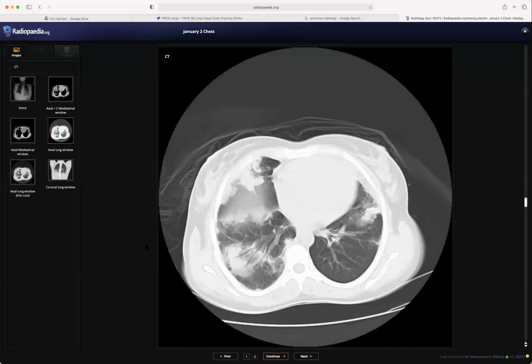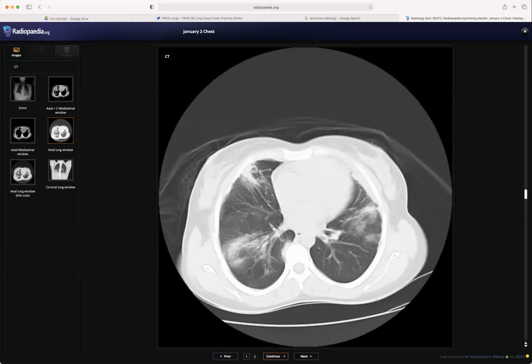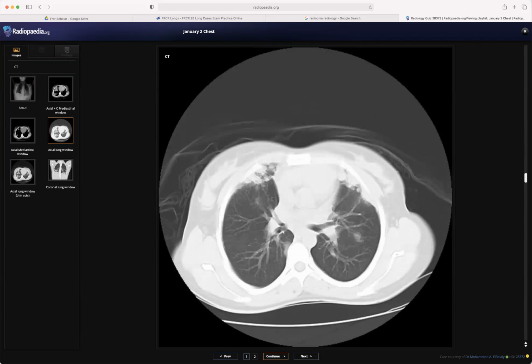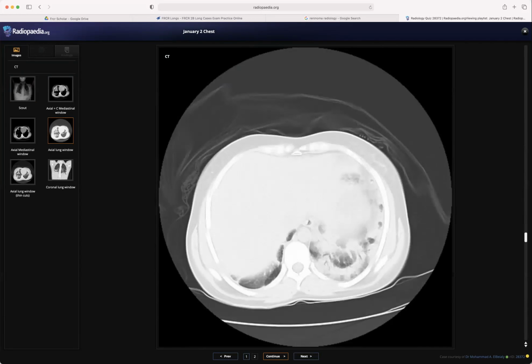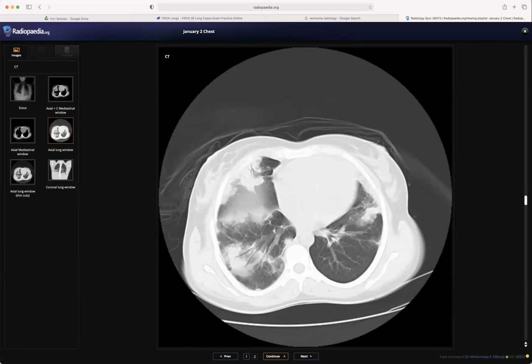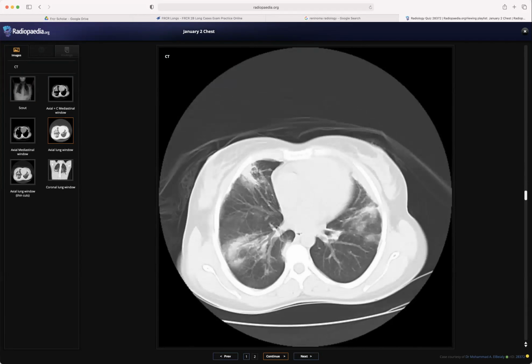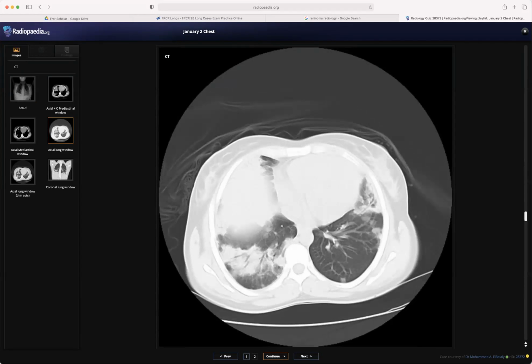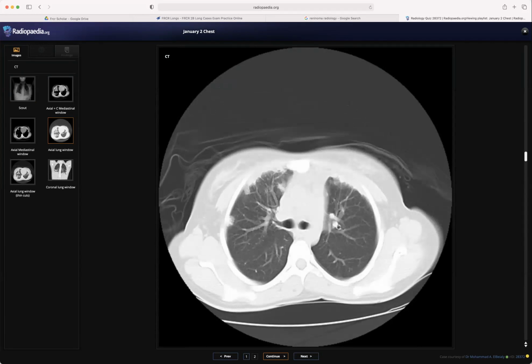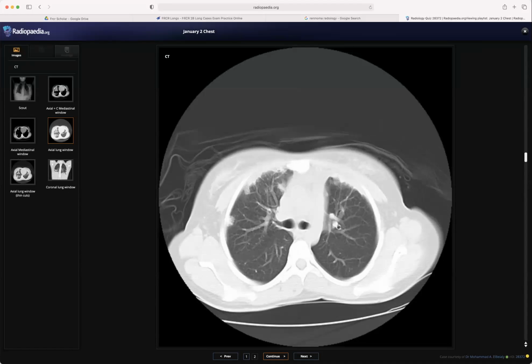Moderator: 15 seconds, so if you could wrap it up. Okay, sorry. The patient is presenting for the first time with dyspnea. The lung window provided shows multiple patchy areas of consolidation as well as ground glassing involving the lower zones, and they are predominantly peripheral, and the lung volume is relatively maintained, and no obvious mediastinal lymph nodes that I could make out in the lung window.